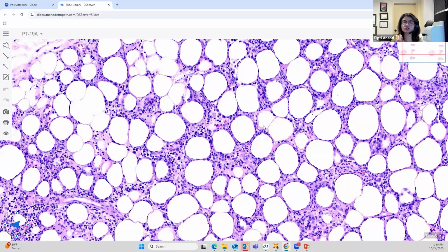Is it dirty but producing ghost adipocytes, which is pancreatic panniculitis? Is it a clean pattern of fat necrosis, not neutrophilic, but more lymphocytic, which makes you think about hyalinized fat necrosis in lupus profundus? Or if it is very bland with just histiocytes and with those nice membranocystic changes, which is your lipodermatosclerosis or sclerosing panniculitis?